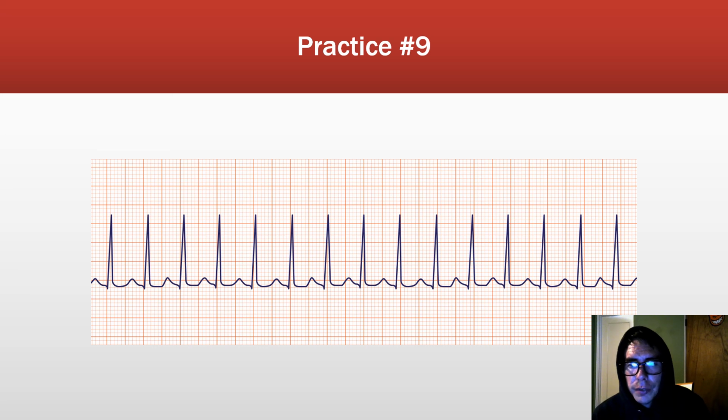This is very regular. There are no P waves. There probably are. It's just that when beats get faster, they kind of push the complexes and things together. So chances are that the P wave is actually hidden within this T wave right here. So these are both T and P. But we can't discern P waves, so no P waves as far as we're concerned. The rate, starting on this guy right here, is a good one. Got 300, 150, so their heart rate is at 150. No discernible P waves, regular.